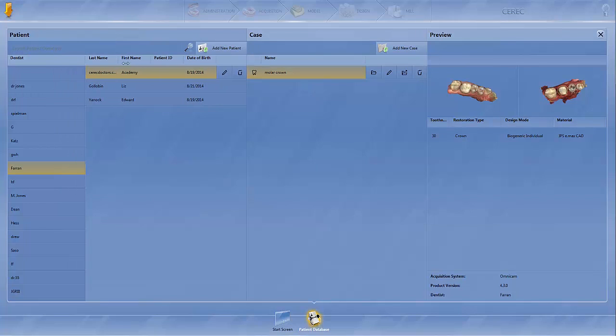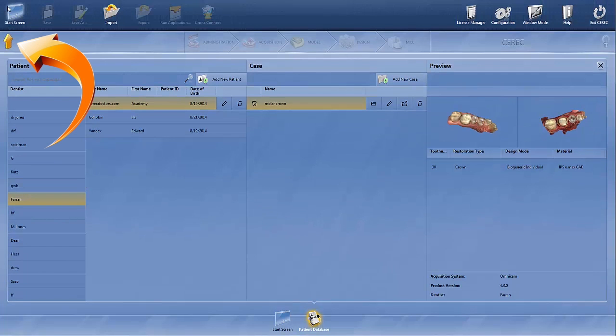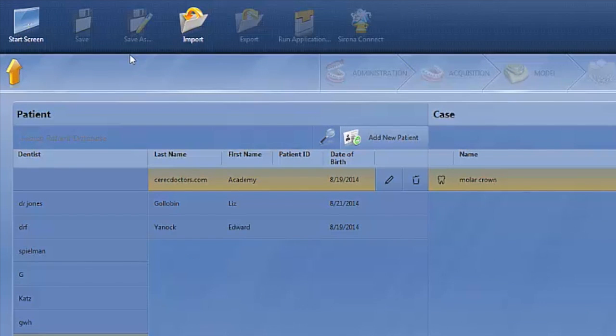Over here, these columns you can change them, make the names longer or smaller. So this is a revised patient screen, and it's much more user-friendly and much more intuitive. The other thing that we'll explore in this first video is our configuration menu. As I click on this arrow up here, we have our configuration menu along with other icons.